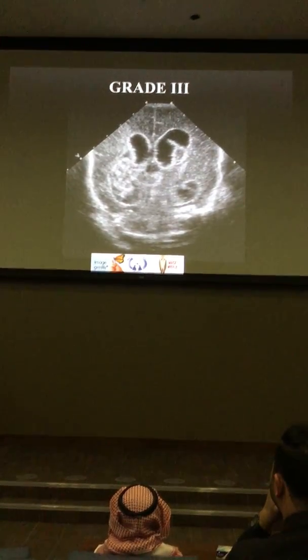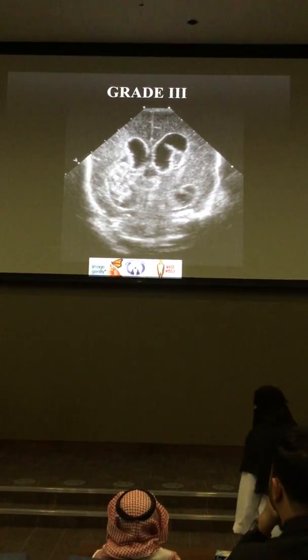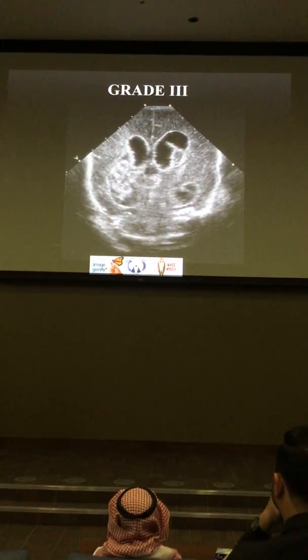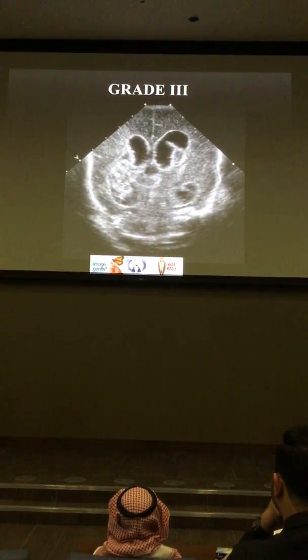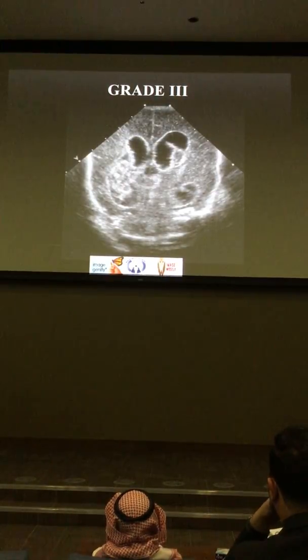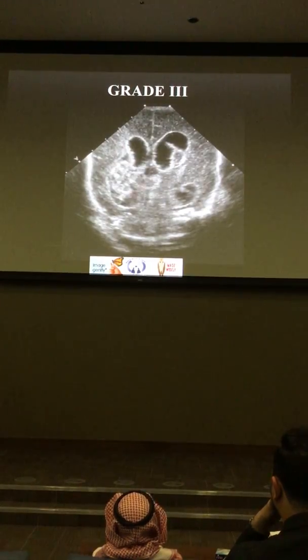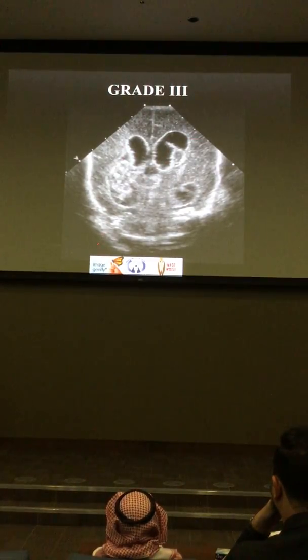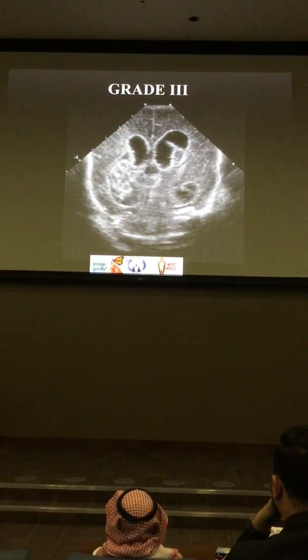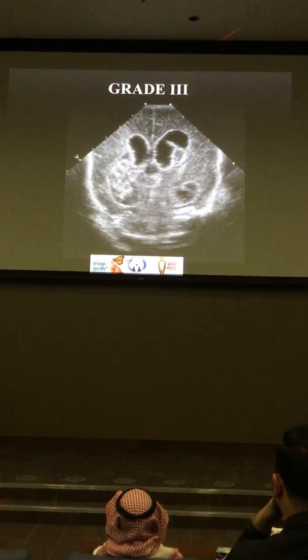Also, we are always using the term ventriculomegaly. You have to differentiate between ventriculomegaly and hydrocephalus. Hydrocephalus is a red flag. Ventriculomegaly is just big ventricles doing nothing. The way to assess that is usually a clinical assessment, but by imaging you can suggest it by the ballooning of the ventricles and the effacement of the sulci. When you go to the linear plane, you can see the sulci are effaced, so you can suggest this ventricular system is under pressure, so it's a hydrocephalus. It's not just ventriculomegaly. Anything else in this image?